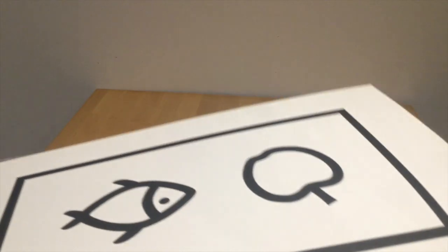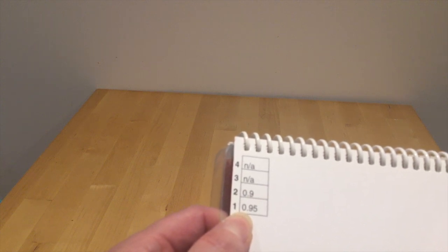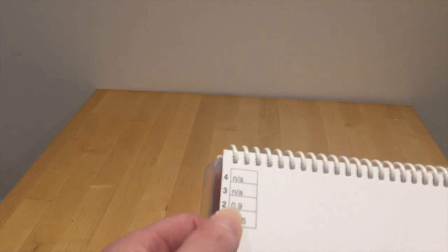Okay, so next one we're going to flip over. Just let you see the tab. It's got 24 in bold. You can see that now on the right. But remember, this is about Logmar. And flip it over. We've got 2 pictures here. And again, in our corner, we've got here. If they get 1 correct, then the acuity is 0.95 Logmar. If they get 2 correct, it's 0.9.